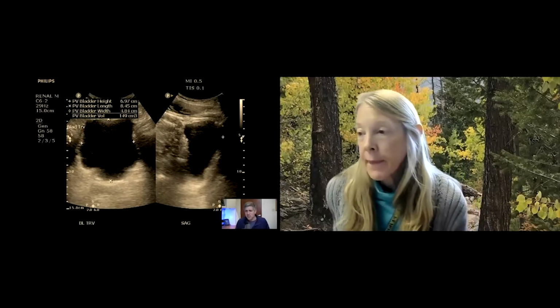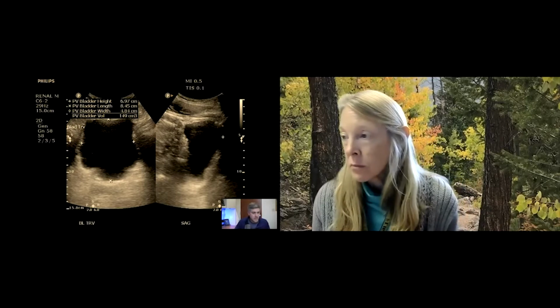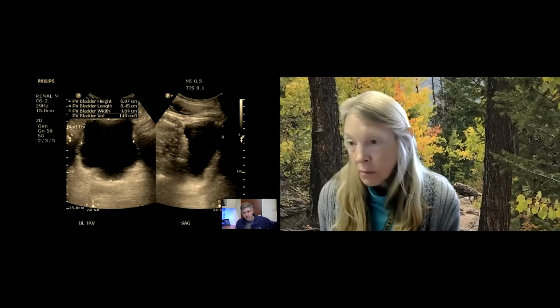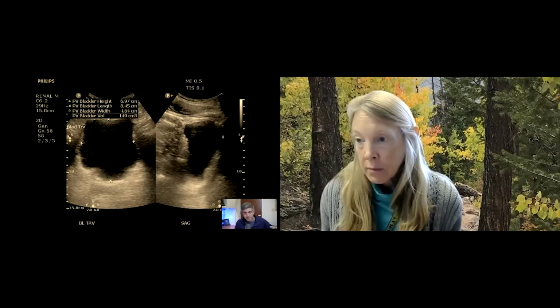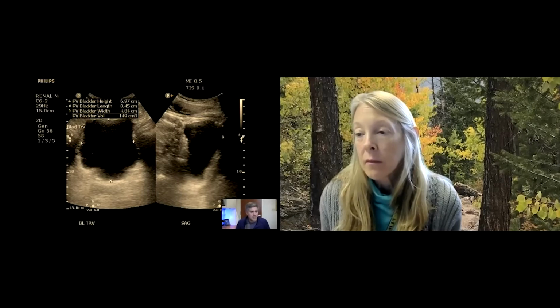All right. So that's anatomically what it looks like. Sonographically, it's going to look about the same as we'd expect based on our anatomical understanding. It's going to be a fluid-filled structure. And remember from our physics conversations before, simple fluid is going to be anechoic, right? There's nothing inside the fluid to reflect the echoes, and so it's going to be black. It's going to be that black hole that we see on the ultrasound.